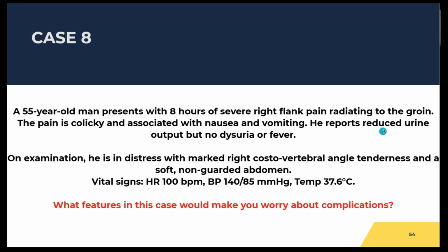Okay, so I just brought up this case again, and I just wanted to ask, what features in this case would make you worry about complications of a renal stone?